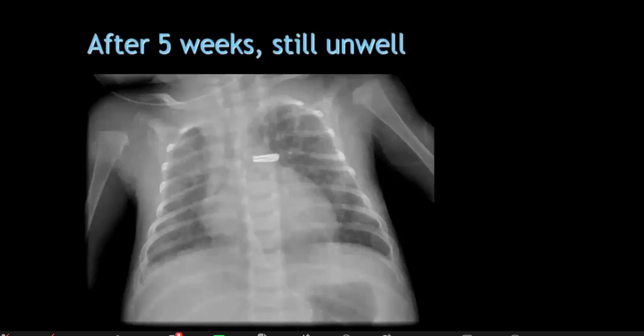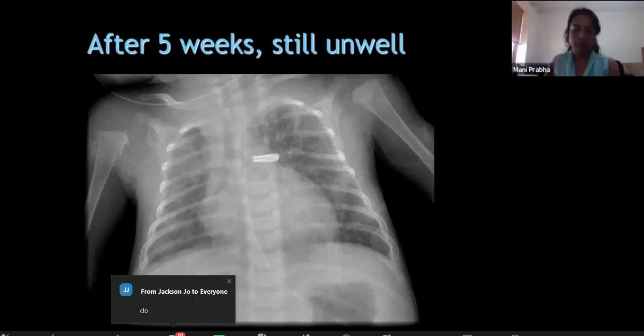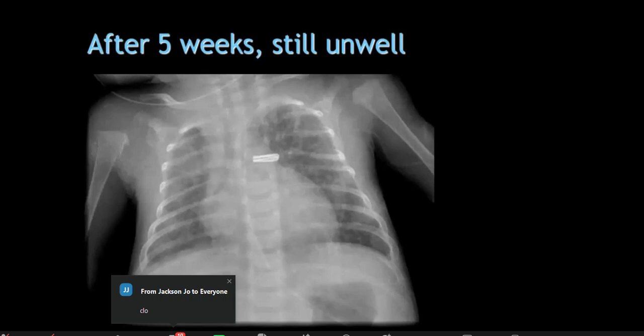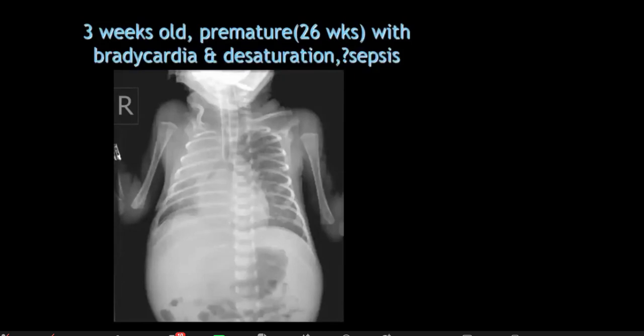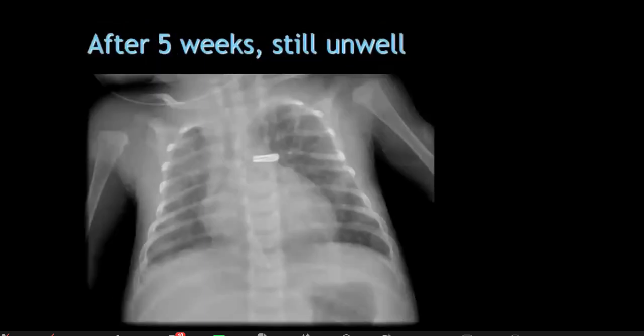So, as the patient was... it could be there are translucencies. I can see the linear lucencies in both of the lungs. Either I will ask for the previous history, if the child is on any ventilation. So on the basis of these findings, the first differential is pulmonary interstitial emphysema.